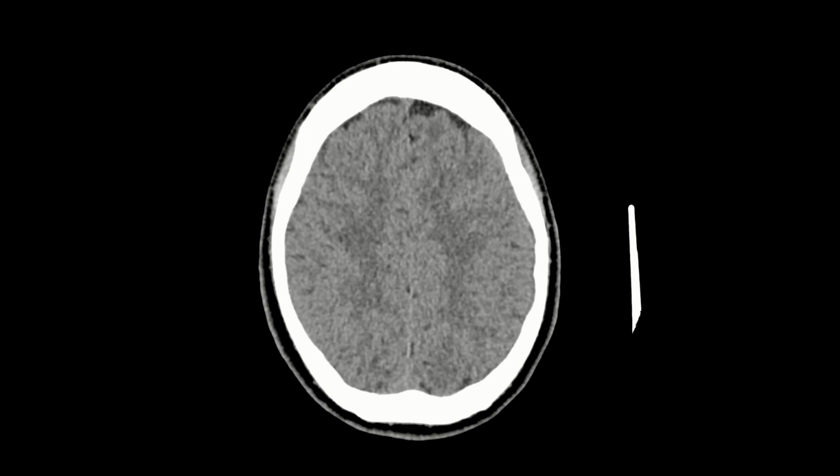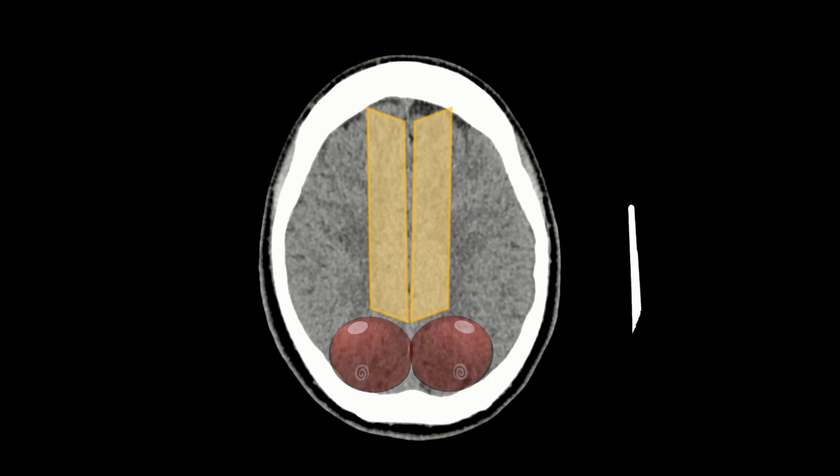Right, so first we're going to talk about the region above the lateral ventricle. So think of it this way. We have the interhemispheric fissure and thin bands of the cerebral hemisphere right next to the interhemispheric fissure supplied by the anterior cerebral artery. So I usually think of it like a guy wearing pants with boots, like this. So the pants represent the anterior cerebral artery area. The boots themselves, they represent the posterior cerebral artery region, and the rest of the brain, whatever you see, is supplied by the middle cerebral artery.